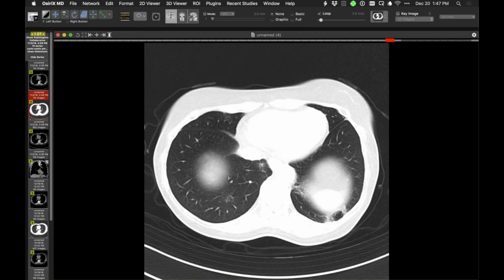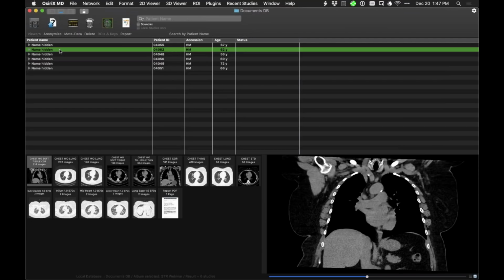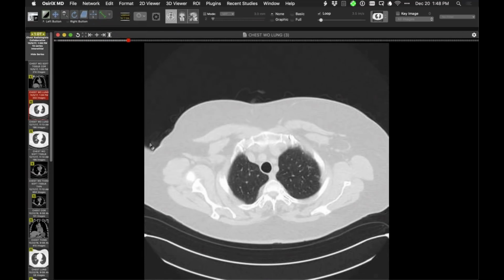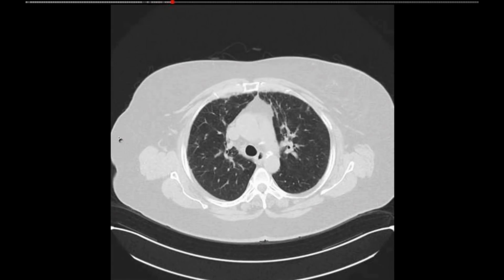But a very classic presentation of sarcoma, cystic lesions, and secondary spontaneous pneumothorax. The last one I'll show you is interesting from the point of view of the imaging pattern, as well as the fact that I have an open lung biopsy report to show you. So in thinking about how one might describe and classify this interstitial fibrosing lung disorder, let me make this big. Let's see what we have.